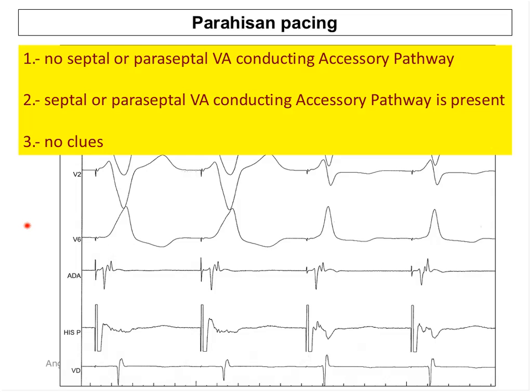So looking at the atrial signal, what do you think? So now you are voting, and we will see the results here probably in a few seconds, so we can tell what is your opinion about this tracing. Very, very good. Now we got 89%, a great difference in your answers.